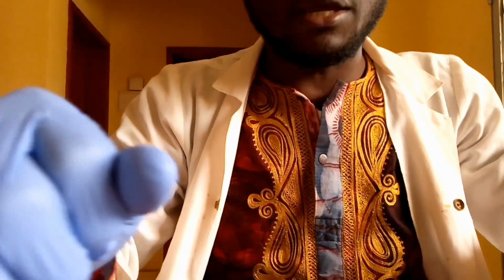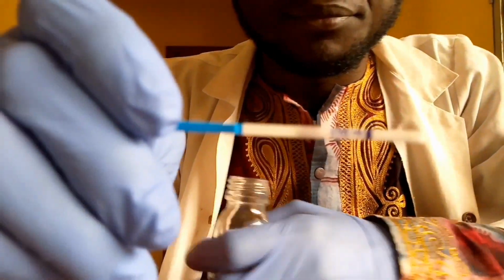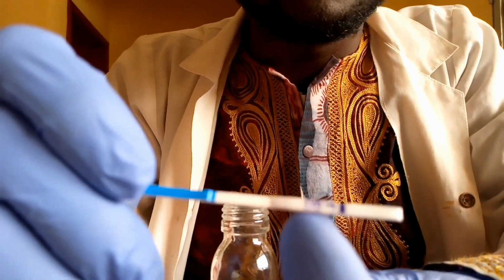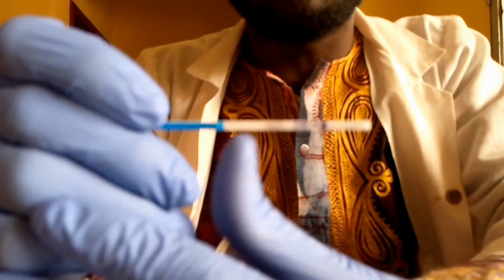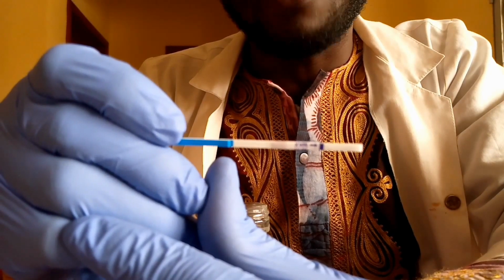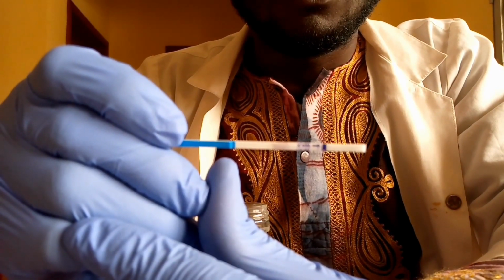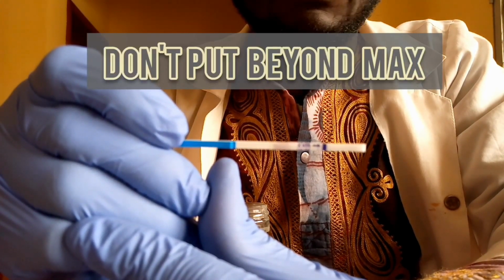We are going to do the same for pregnancy. For pregnancy, you also have the level where you have the max, meaning maximum. So you don't have to put your test strip beyond the maximum mark. So this is your test strip.